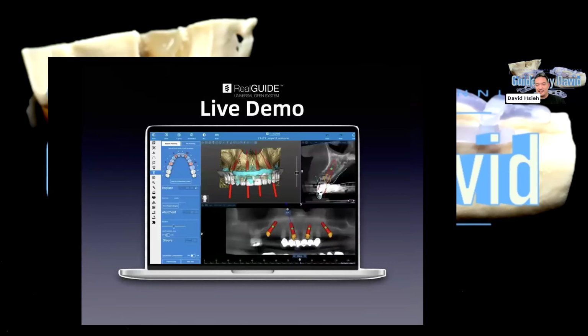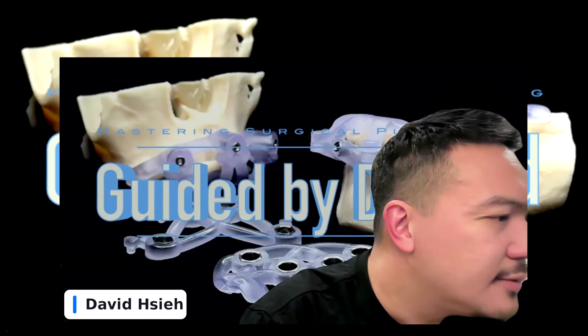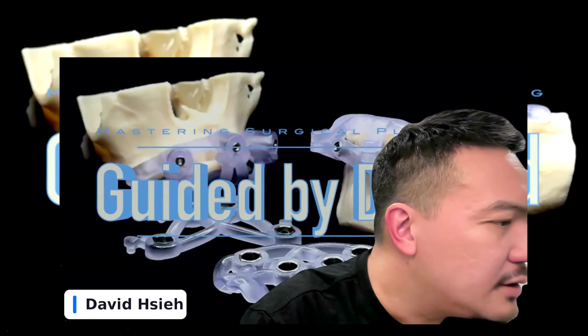All right, so let's move forward to the planning session. Let me share my screen here.